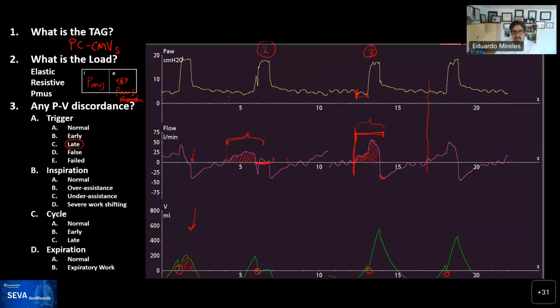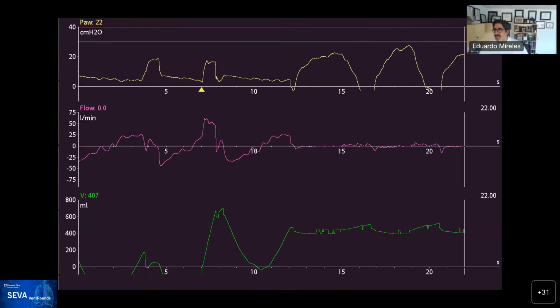And I want you to see what now the patient is doing. And so there's a small inspiratory effort, and then the pressure goes up, so the patient is bearing down, increasing the pressure. Then the patient takes a breath in, and this goes down like that. Then the patient bears down again against the machine, and then breathes again. So the patient was bearing down against the machine with very small inspiratory efforts. So all of these that I'm shading is expiratory effort from the patient.